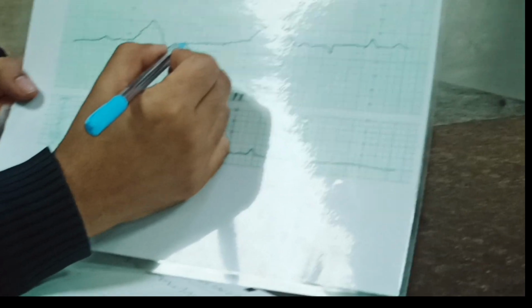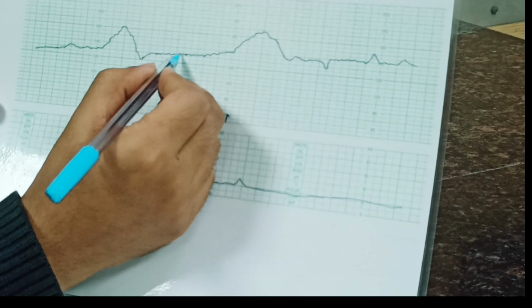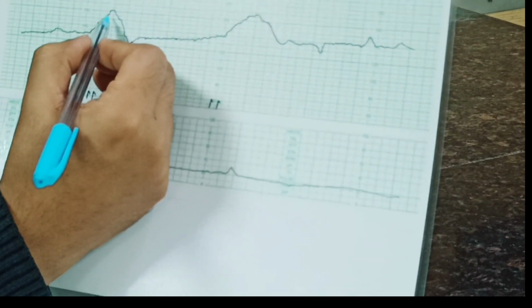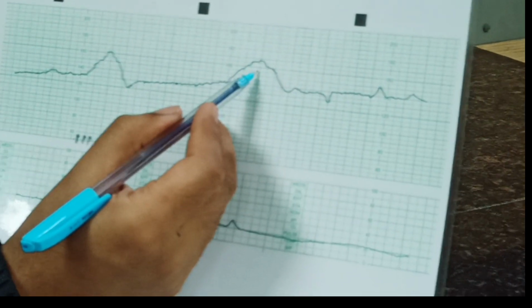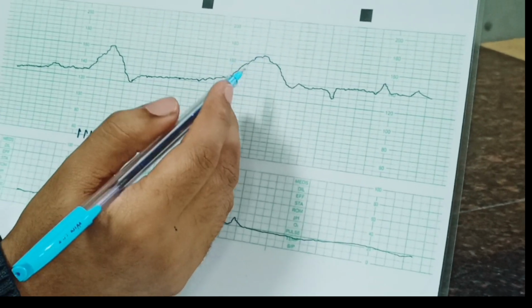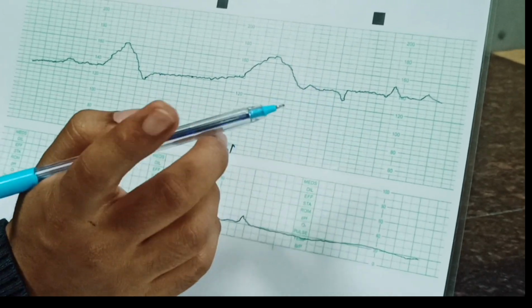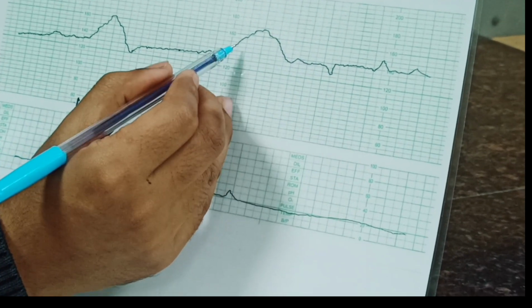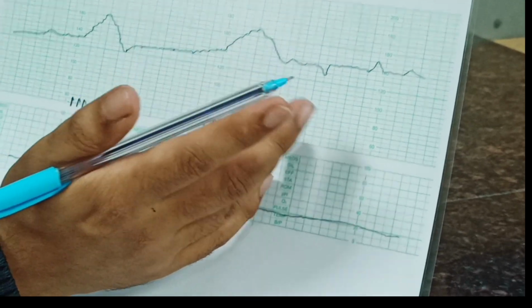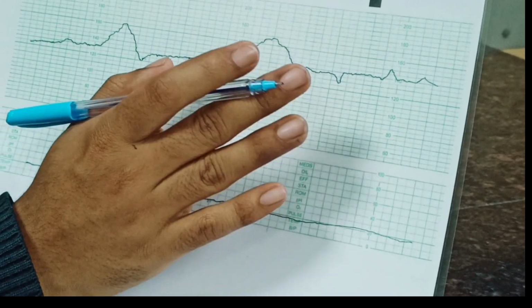Now this fetal heart rate baseline is around 140 beats per minute. Variability is reduced, that is less than 5 beats per minute. There are two obvious accelerations. We say accelerations when the heart rate increases by 15 beats per minute and remains for at least 15 seconds. And there are no obvious decelerations, because decelerations are also defined as a decrease in heart rate by 15 beats per minute which persists for more than 15 seconds. So this is the initial trace or recording which you say.